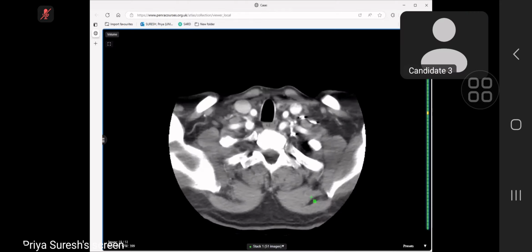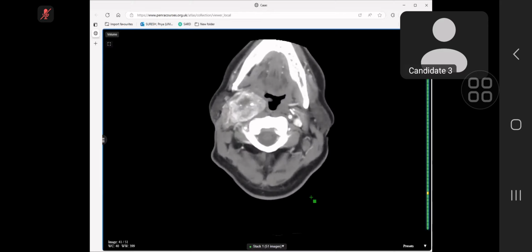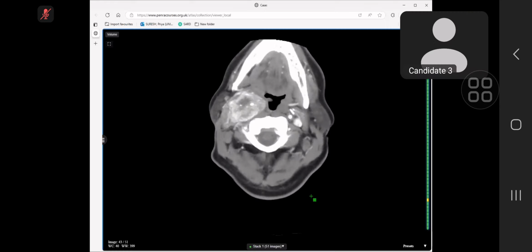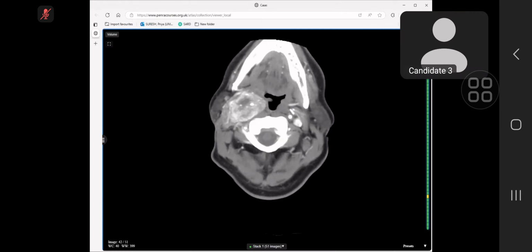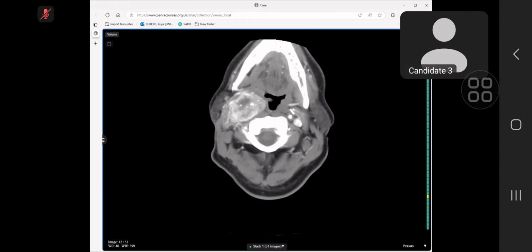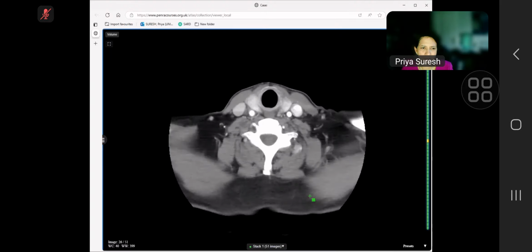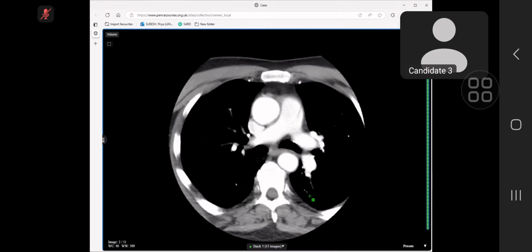I am provided with a CT chest in the arterial phase, and I'm looking, yes, there is a moderate to markedly enhancing mass, which is noted in the right anatomical site of the internal carotid and common carotid artery, in between the carotid bifurcation, which is showing multiple intralesional enhancing dilated vessels.